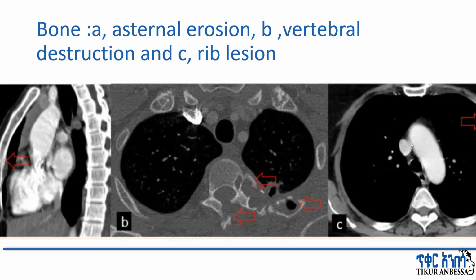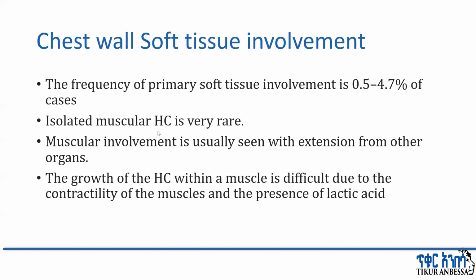This one, a little bit, the screen has covered. This is a rib hydatid cyst. I'm sorry, I will show you by minimizing the pictures. So chest wall and soft tissue involvement.